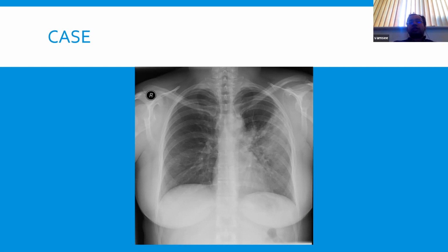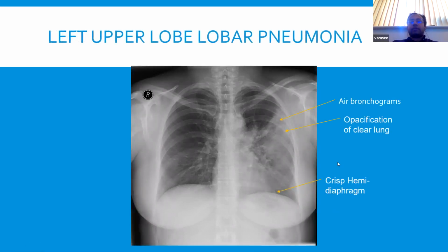Fine. So in this particular case, this would be a classic case of a lobar pneumonia. You've got widespread patchy opacification extending in the left, middle, and lower zones. Bear in mind, I say zones. The hemidiaphragm is actually quite crisp, and you can see that very clearly along there, suggesting that this isn't lower lobe pathology, but upper lobe. If you're not sure in the exam, don't stress about it. Just say that it's more likely to be suggestive of lobar pneumonia.